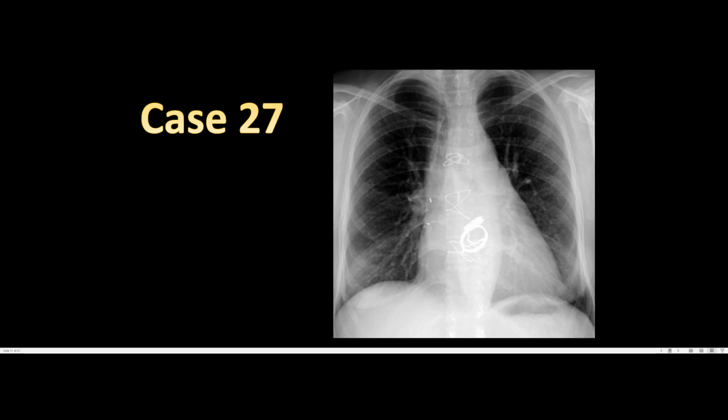You can imagine this imaginary line above and below. The ones below, like you see in this picture, could be more than likely an aortic valve or a mitral valve. If you don't remember, again, patient's history helps a lot. From the patient's history, you will be expected to know that this patient had valvular heart disease and did valvular replacement surgery. So this could be more than likely an aortic valve replacement or a mitral valve, which is very nearby. So that's pretty much it.